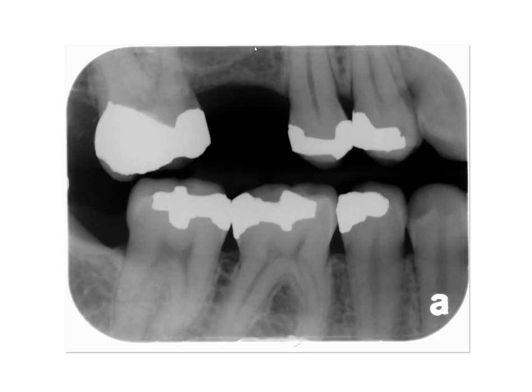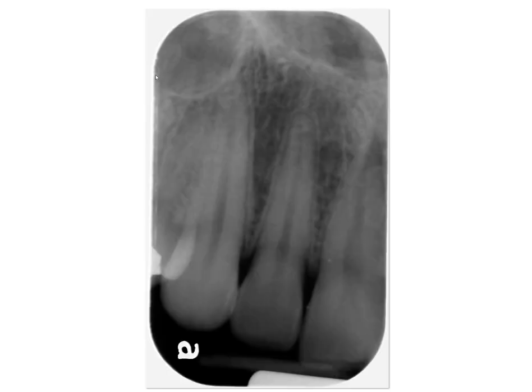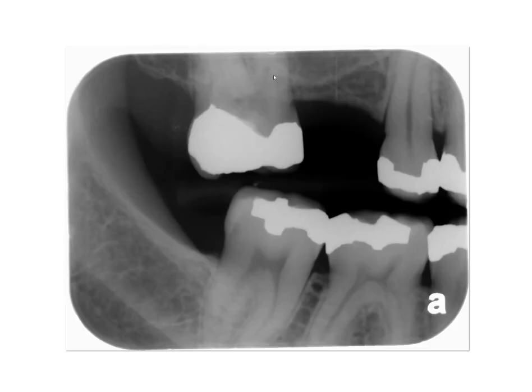You can see a portion of the maxillary sinus, external oblique ridge. Again, floor of the maxillary sinus, nasal aperture. And this radiolucent area represents lateral fossa. We see maxillary sinus once again. External oblique ridge, this represents the internal oblique ridge. Here's the submandibular gland fossa, and it's likely that we're seeing part of the mandibular canal cortication.